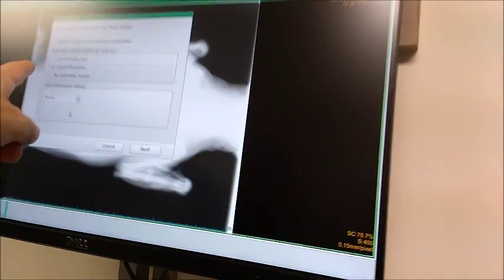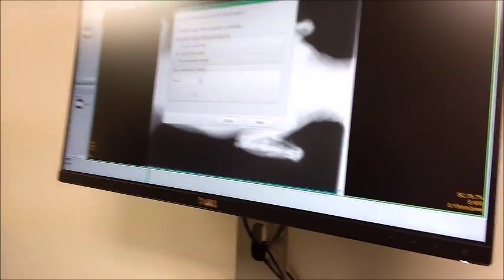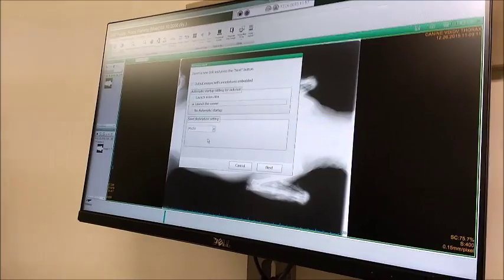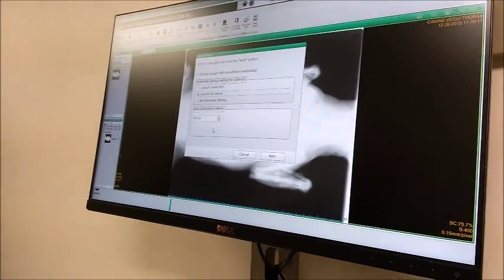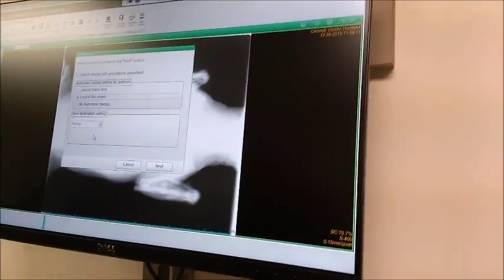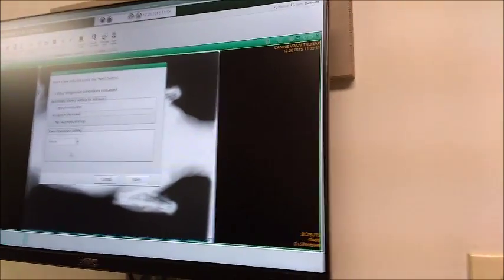Do you want it to launch the index? Do you want it to launch the viewer? Because there are so many things to click on, and most people aren't going to know. Or do nothing? Launch the index seemed to be sort of confusing. That would just launch that whole list of files. They then would still have to sort through and find the right application. So if you say launch the viewer, that's sort of a no brainer. Okay. It's like this is what they'd see.